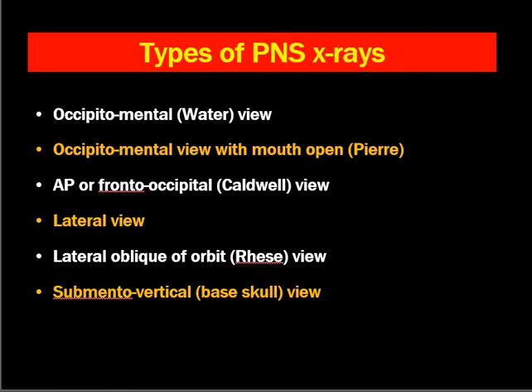Hello, dear all, namaste. In this video, I will be discussing the X-ray of nose and paranasal sinuses. The different types of PNS X-rays are occipitomental or Waters view, which is the most commonly performed X-ray, followed by occipitomental view with mouth open, which is also called Pierre's view.